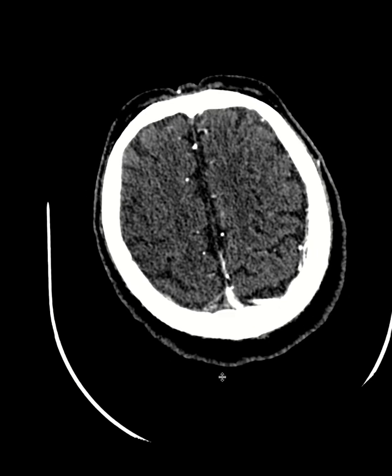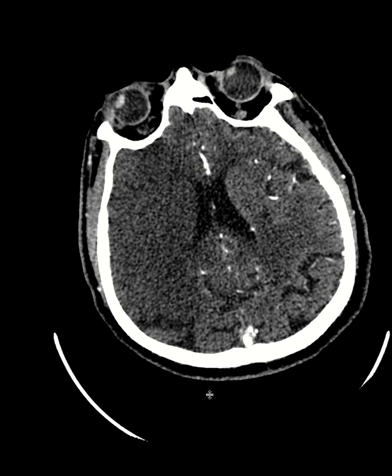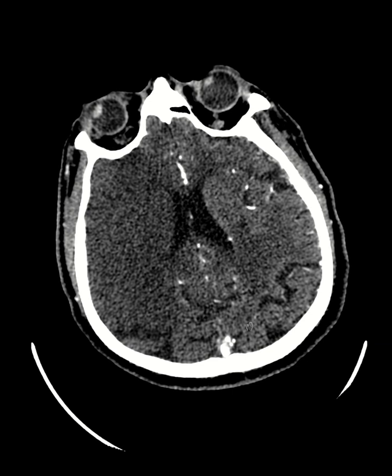Okay. So the next important thing in a stroke is to talk about the mass effect and the hemorrhagic conversion. In patients who have a large area of infarct or a large area at risk of infarct, there is going to be a great risk for hemorrhage afterwards, whether they have an intervention or not. In both situations, if you sit on these patients or if you do some intervention, they are at risk of hemorrhagic conversion.